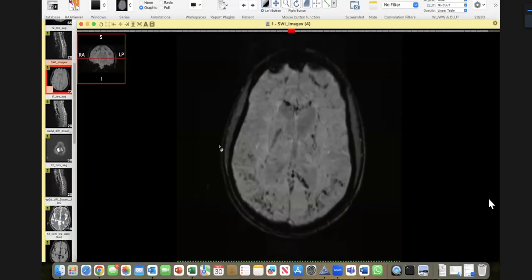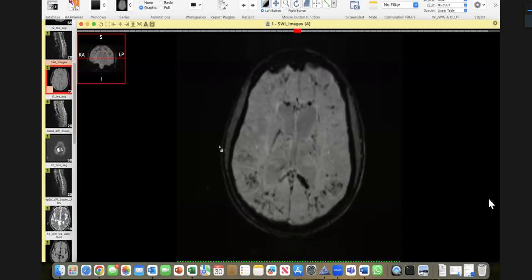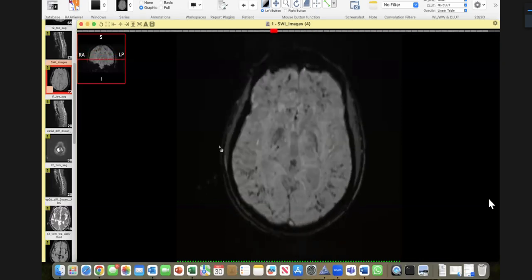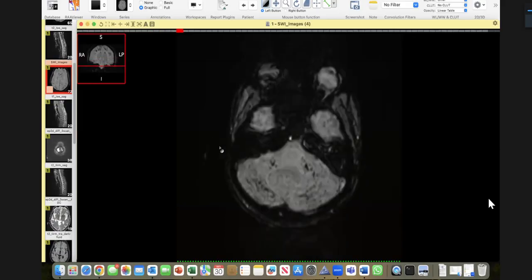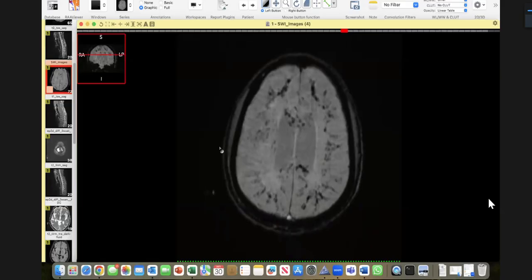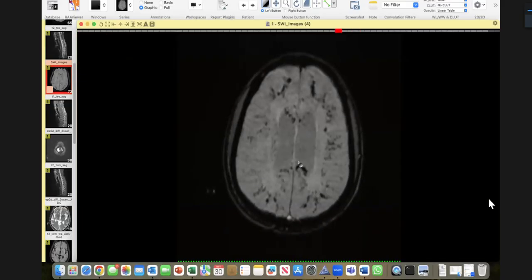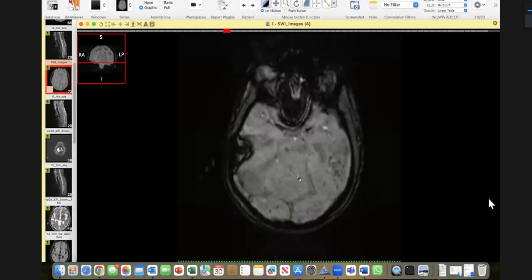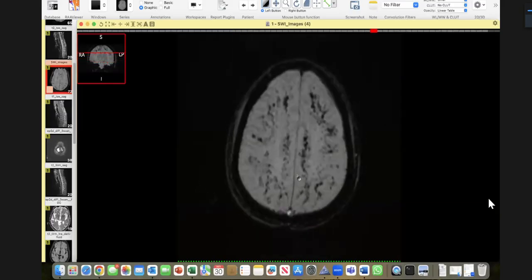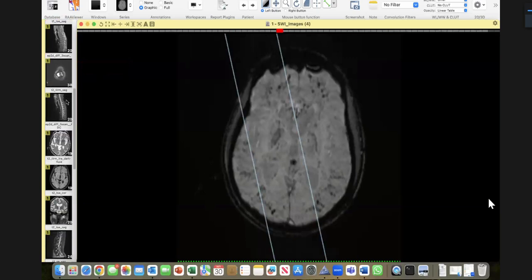Fat embolism can occur even in cases of trauma. Please remember, femur fracture or bilateral femur fracture, etc. They go at a particular location and there will be a shower of emboli. You will only see it on a SWI sequence. And the classical locations include the corpus callosum. If the corpus callosum is involved, the genu and the splenium, the internal capsule, etc. Subcortical white matter, U fibers will be involved. It's bilateral, symmetrical. So this case was actually sickle cell disease.